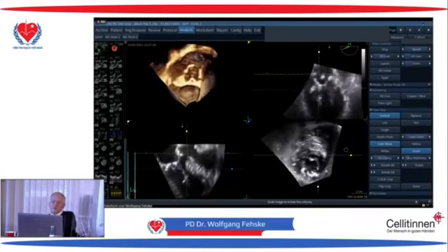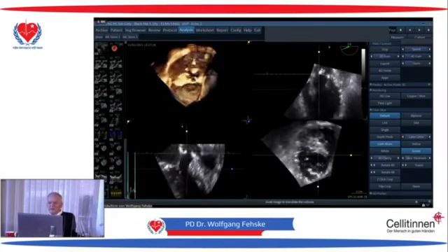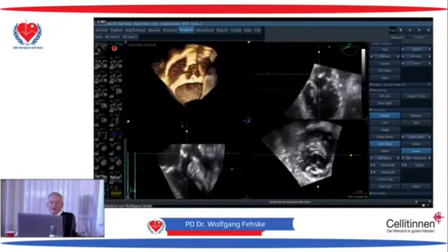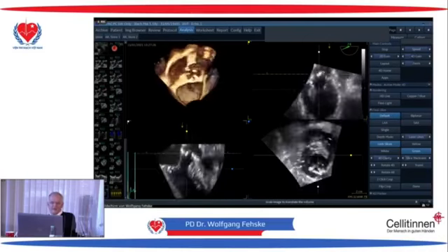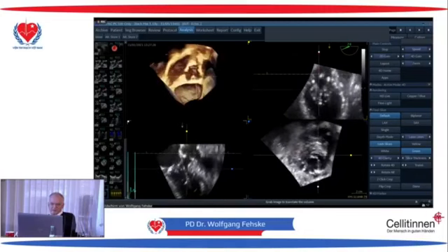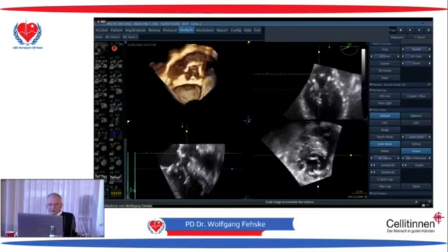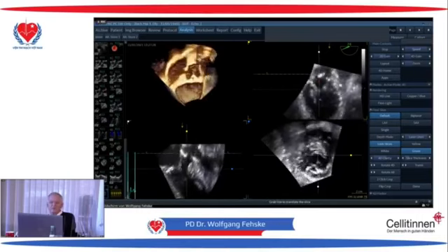And this is only to be done by echocardiography. You see the calcium inside the posterior leaflet. And if you put in a longer stent, like the Evolut self-expanding Medtronic valve, or Portico valve or whatever, then you risk, first of all, a subaortic stenosis, which is a problem.